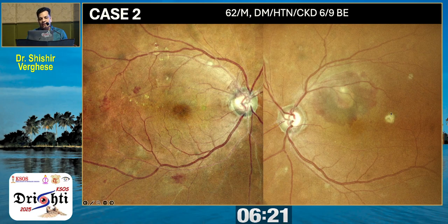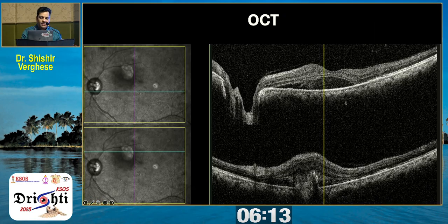And in the left eye, those features are also there, but along with that, there is also a submacular or parasubmacular hemorrhage, what you can see, and like a small bump. So when we did the OCT through the fovea, it had subretinal fluid, and when you did the OCT through that bump or that area of the hemorrhage, you can see this small polypoidal lesion, what you see. So this was PDR, along with that, patient had a PCV also in the left eye.